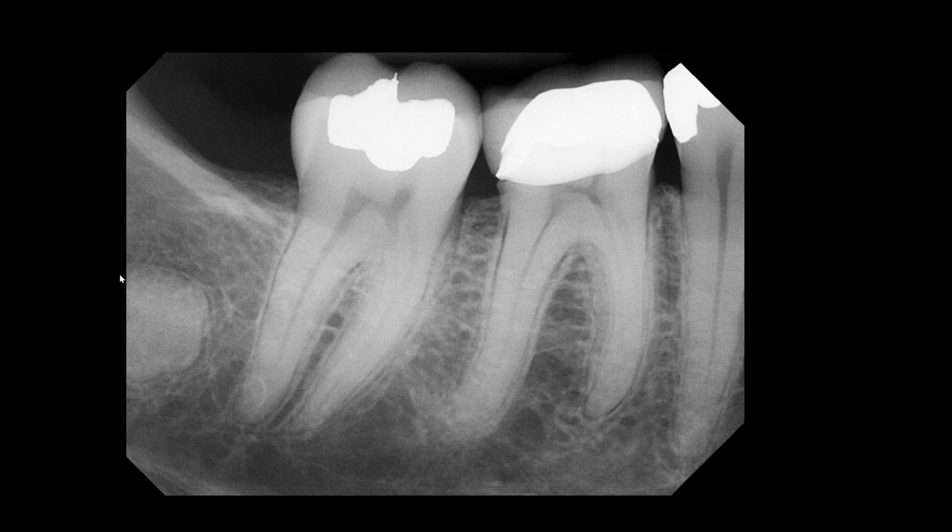But presuming, and there's a big assumption here, that this is very well localized in this area, another thing that we should consider is odontoma. In order for me to be a little more definitive about odontoma, I would have liked to see radiodensity of enamel and some pulpal density, but those are very good differential diagnoses to start out with.